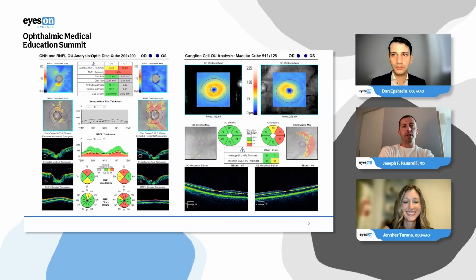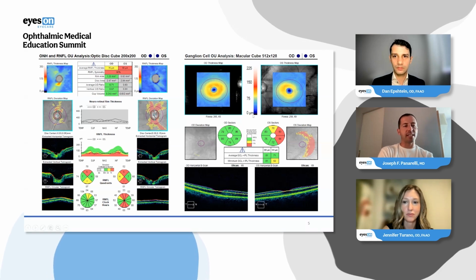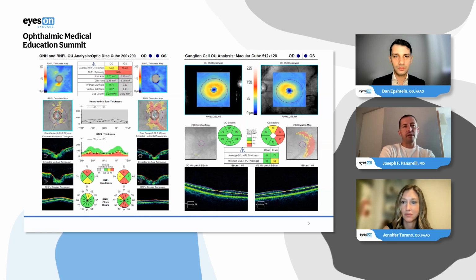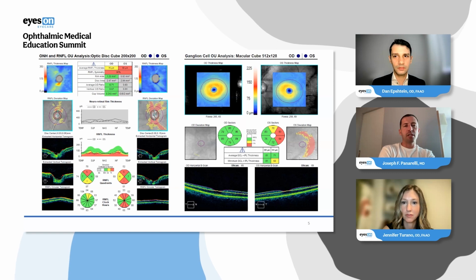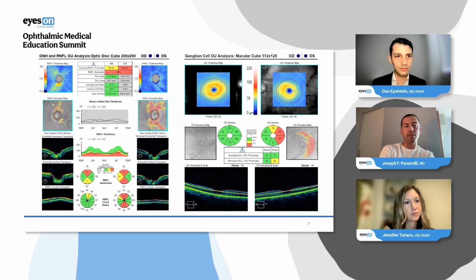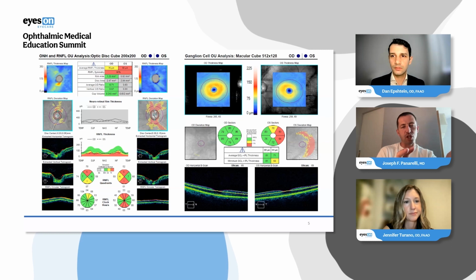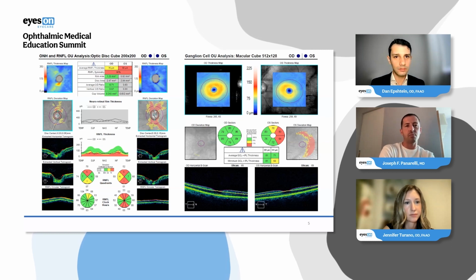Well, Dan, that was a really great case. Now it's time to open up for a fun, very quick 6-minute discussion. So I'm going to pick both of your brains here about some of the imaging that this patient had. My first question for you, Dan, is what's your initial thought of the right eye? Does it concern you? I think sometimes I get asked what I make of some of those changes. How worrisome is that? Maybe quickly walk me through your thoughts on the right eye.